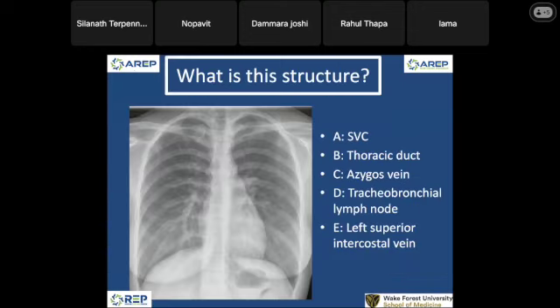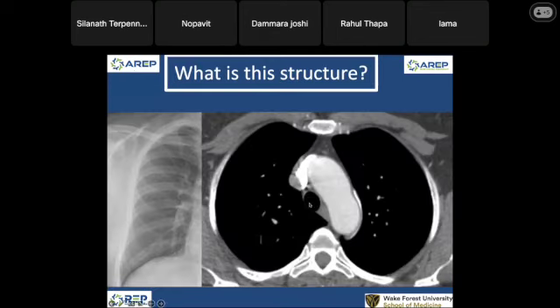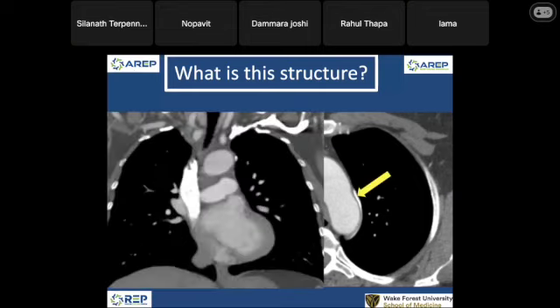Okay, look at my choice. This little guy, this guy. Do we know what structure that is? It's the venous structure. We're talking about that, and we're talking about this. See that? It has a nickname. We call it the aortic nipple.